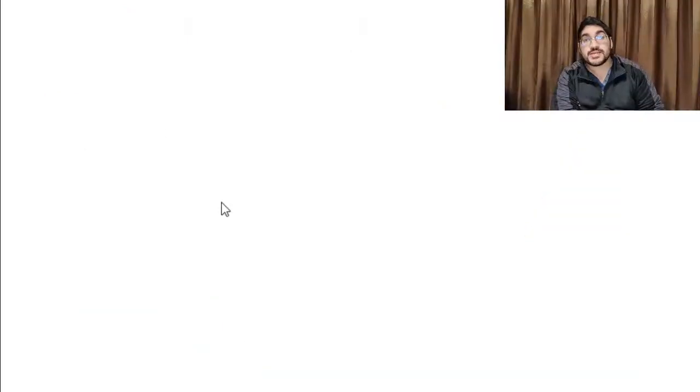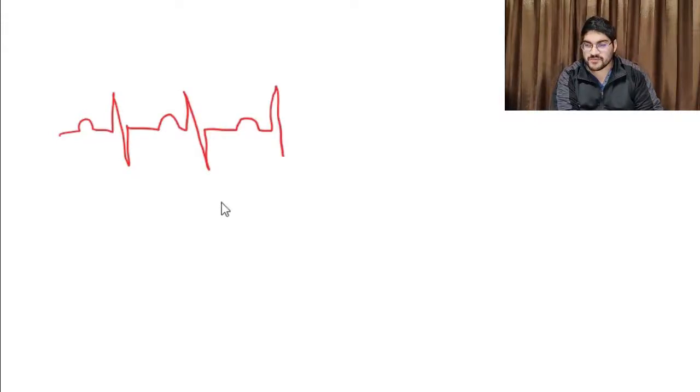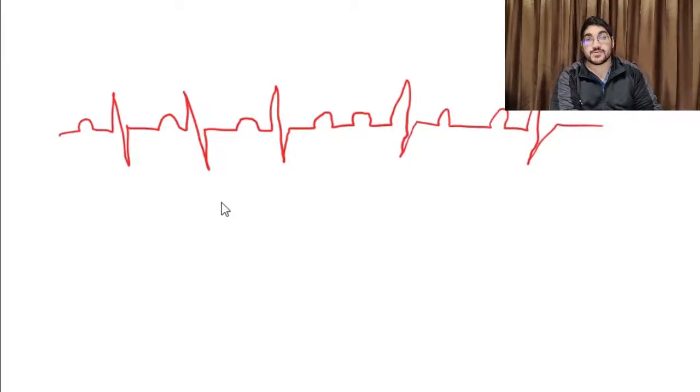Now question 3 is whether or not there's a one-to-one relationship between the P-wave and the QRS complex. What that means is 2 things. Each P-wave must be followed by a QRS complex. You shouldn't have a P-wave that doesn't cause a QRS complex to follow it. You shouldn't have a P-wave with no QRS complex. That already means there's a problem.